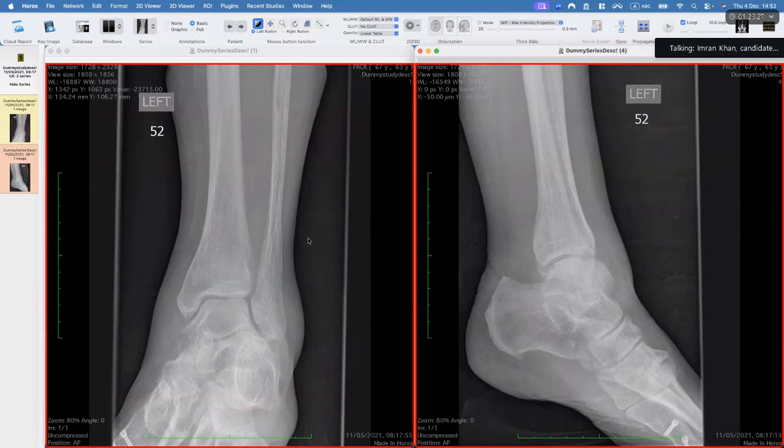It's perfectly fine, mild osteopenia, nothing, not Paget's, nothing to worry about. Maybe there is a stress fracture seen in the calcaneus body. No, nope, this line of sclerosis is not a fracture. If you're talking about this line of sclerosis, that's just the sustentaculum tali. Okay, fine. There's no correlation either, by the way.